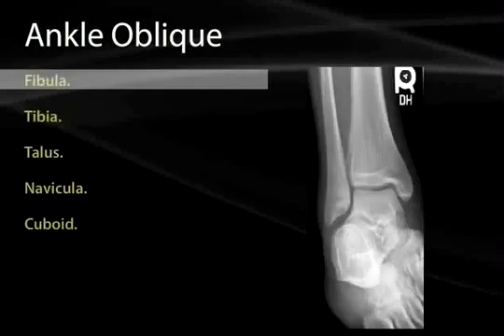If we move down into the ankle, we've seen the fibula; follow and track the lines of the fibula, especially the entire distal third. That's going to be important because a lot of those Potts fractures that we've discussed earlier may have fractures somewhere along that distal third. Remember, this is a non-weight-bearing bone, and that can be easily seen in this view where you can see the fibula is really not accepting any of the forces that will be passed up through the talus.